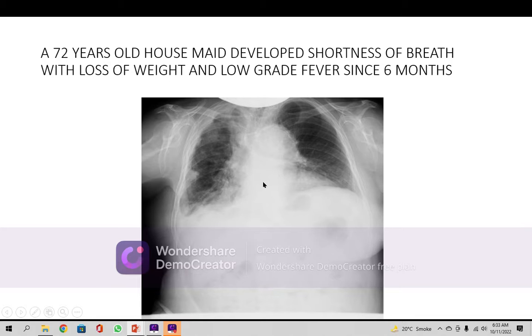Depending upon these findings, acute inflammation is not possible, or rather chronic inflammation is more likely, resulting in the fibrotic reaction. And that is tuberculosis, which in our country is very, very common, and it results in the fibrotic reaction. Remember that coronavirus can also cause a fibrotic reaction in the lung. Now this is actually what I have gained from my experience during the management of coronavirus over 2 years, that about 5 to 7% of patients ended up with a fibrotic reaction in the lung.